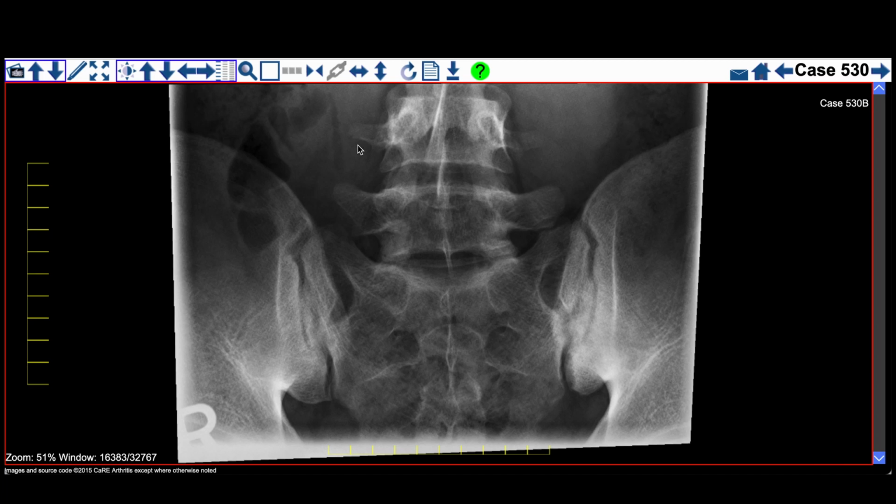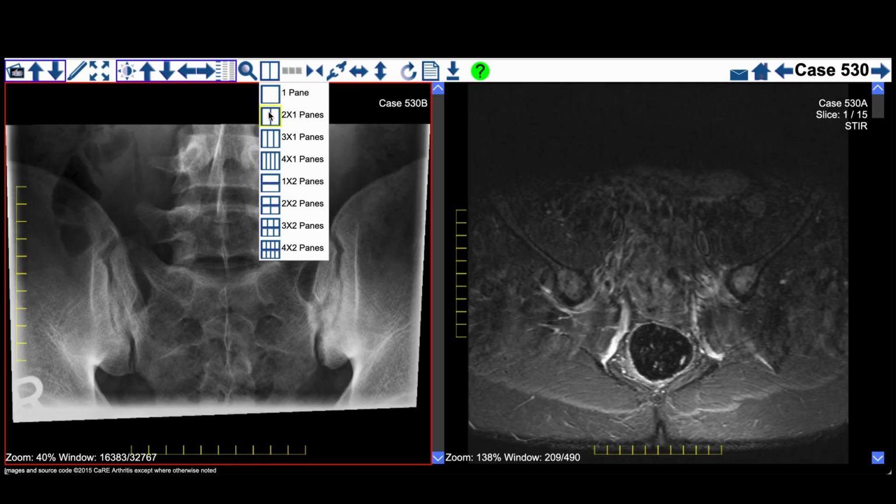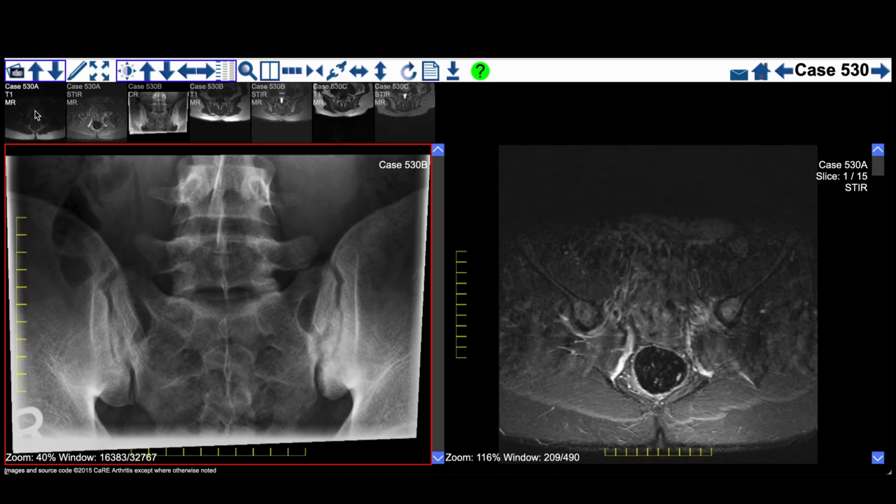So this gentleman was in fact quite keen to participate in our research study, and this required that patients have MRI scans done every year. So let's have a look at his baseline MRI scan.